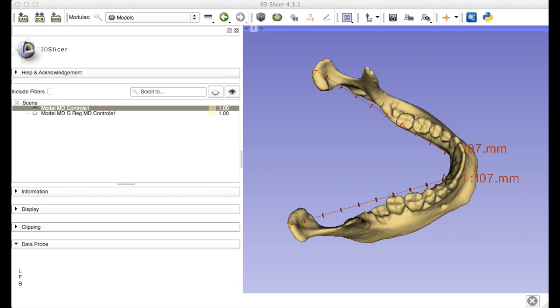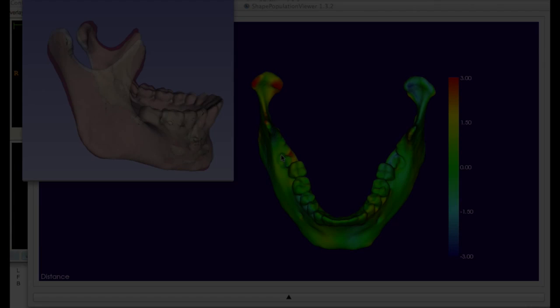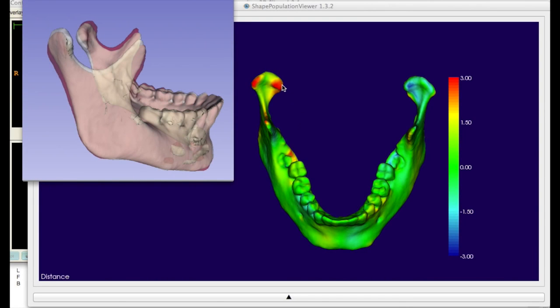When the same model is examined with 3D measurements, 3D images can properly identify asymmetry using superimposition methods, such as a color map. This analysis in 3D image can provide better understanding of bilateral structures. 3D color maps and overlays can localize and quantify asymmetry with better accuracy due to the difficulty of placing landmarks in 2D and anatomical variations.